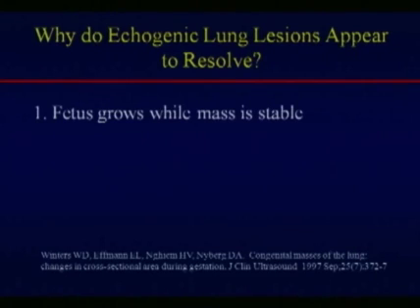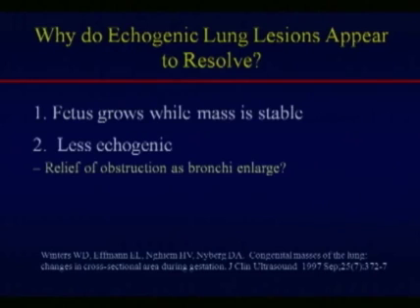But one question is, why do they look like they resolve? And there could be different reasons. The fetus certainly grows while the mass size may be quite stable. Also, maybe there is relief of the obstruction, which could occur, of the trachea or bronchi.